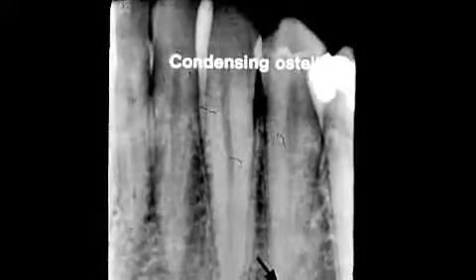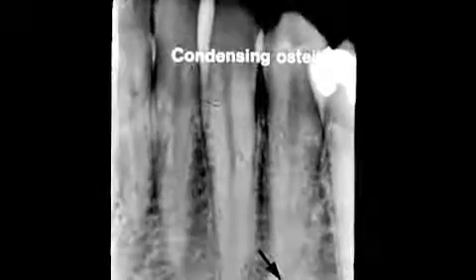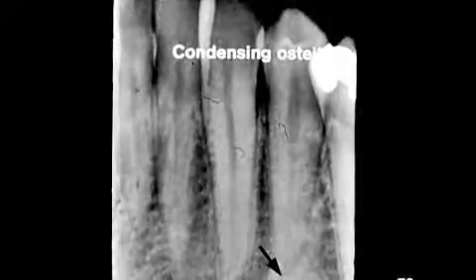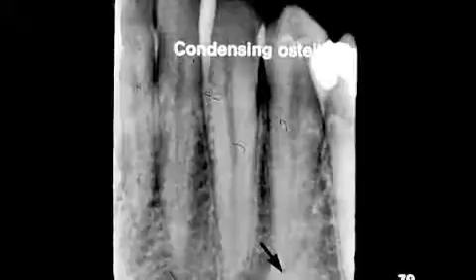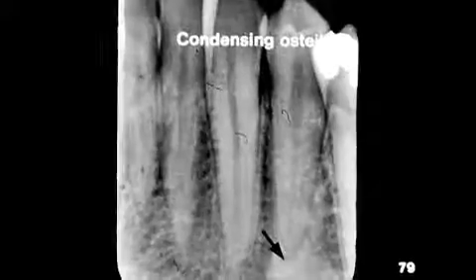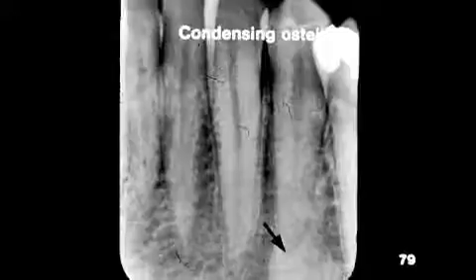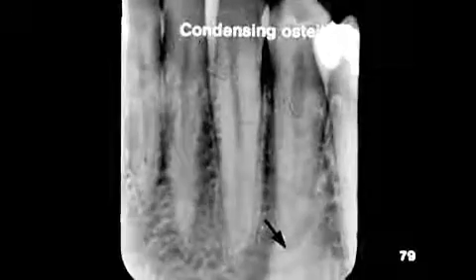If we do a pulp test, we find that the tooth is non-vital. A similar opacity is known as sclerotic bone. Sclerotic bone can occur anywhere in the bone, but if it is at the apex of a tooth and we do a vitality test, the tooth is vital for sclerotic bone.